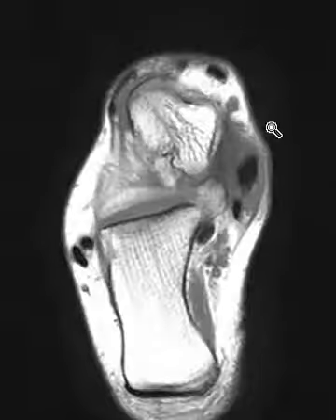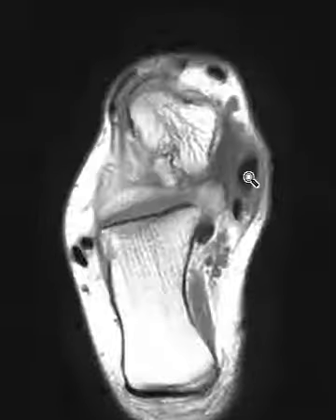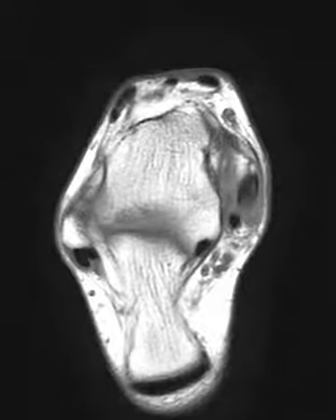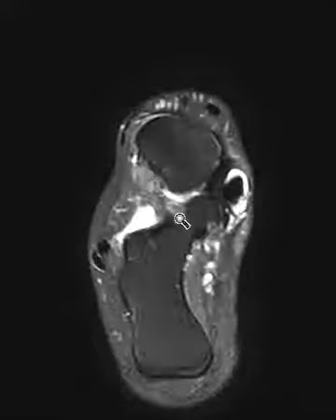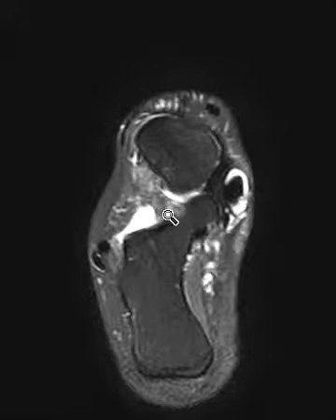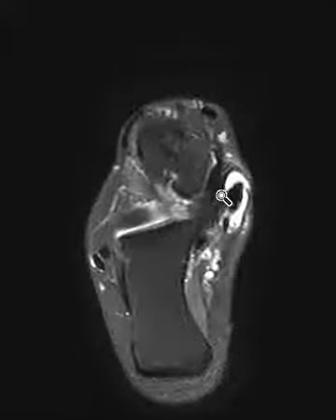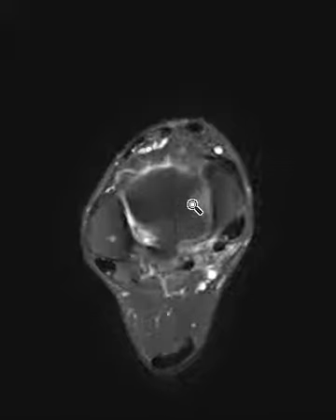They look completely normal. So in the end, this is a case of hypertrophic tendinopathy and tenosynovitis, or hypertrophic partial tear and tenosynovitis, of the posterior tibial tendon with no tendon rupture. And also some probably early inflammatory changes of the sinus tarsi, which may be related to posterior tibial tendon dysfunction. And lastly, that small osteochondral defect of the talar dome right over here.